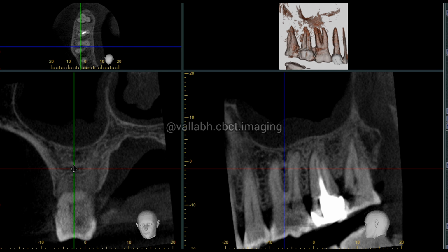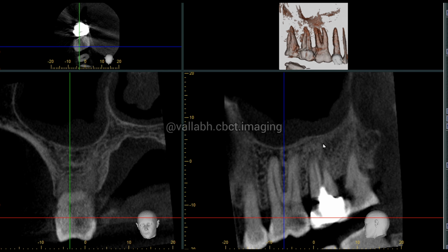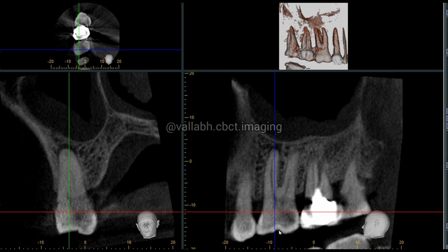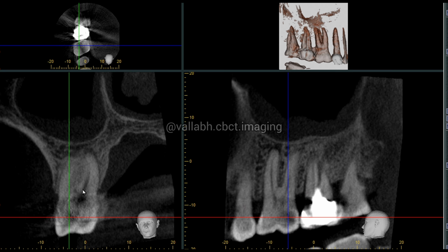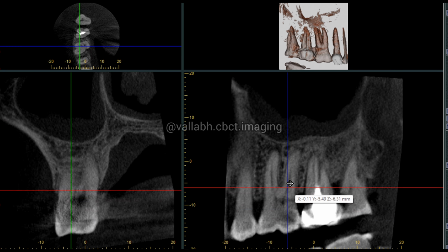The crown aspect also needs clinical evaluation. With the RVG analysis, you can easily make out the periapical pathosis. So definitely some kind of suspected decay. You can check this region of interest below the enamel level or the prosthesis restoration if evident. So this definitely needs some kind of treatment.